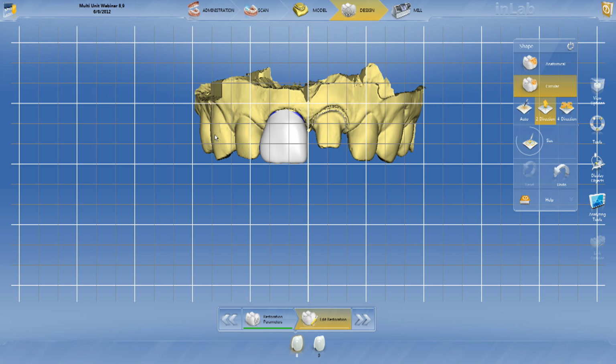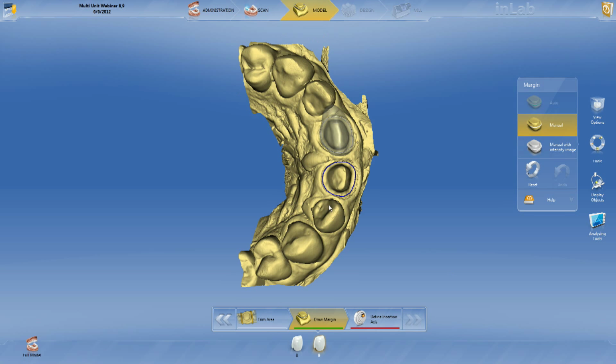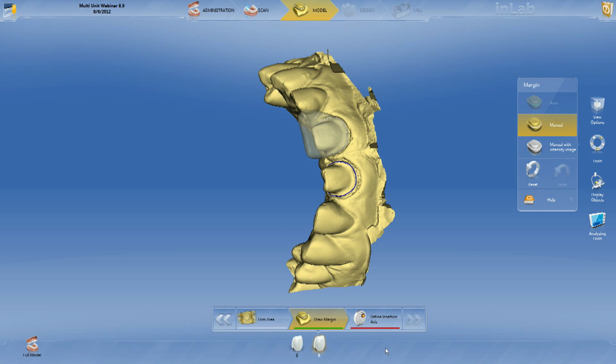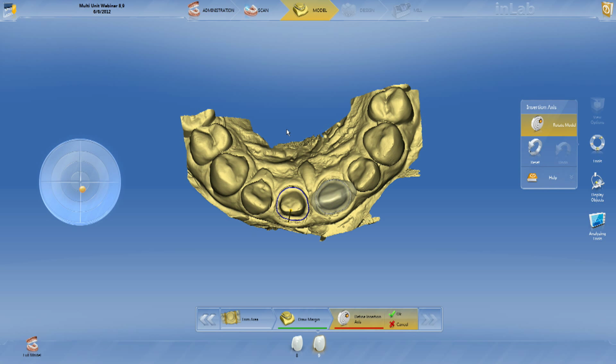It's just a guide. It helps you out a lot. Before, we would have to kind of guess, okay, this one fits, this one's okay, this one's not that good. So we'll position it back. Okay. Let's move on to the next one. The grid will disappear. Hopefully we'll get a good proposal on this one.